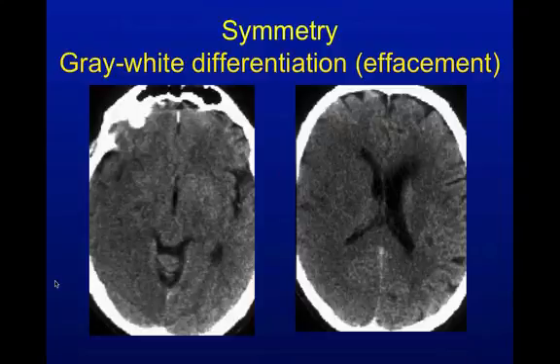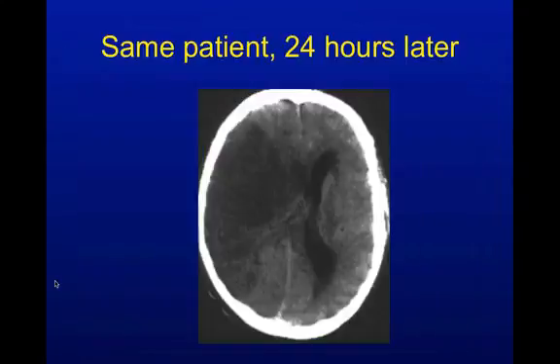This is bad. And 24 hours later, that same patient is looking like this, and it's a little bit easier to see now. But early on, it kind of gives you the clue. There is a huge infarct here. This person's going to do very terribly. Probably got a big middle cerebral artery infarct, and he's going to lose a third of his brain. Okay? And as you can see here, the mass effect that it's causing at this point. The ventricles collapsed, completely gone on that side, and the tissues on that side are being pushed over.